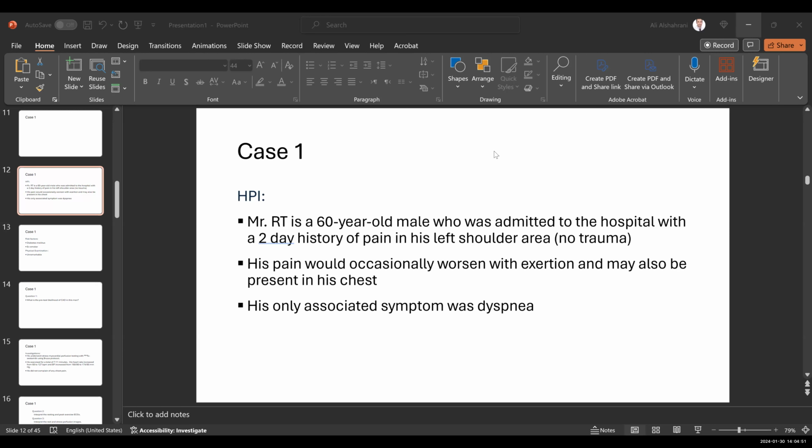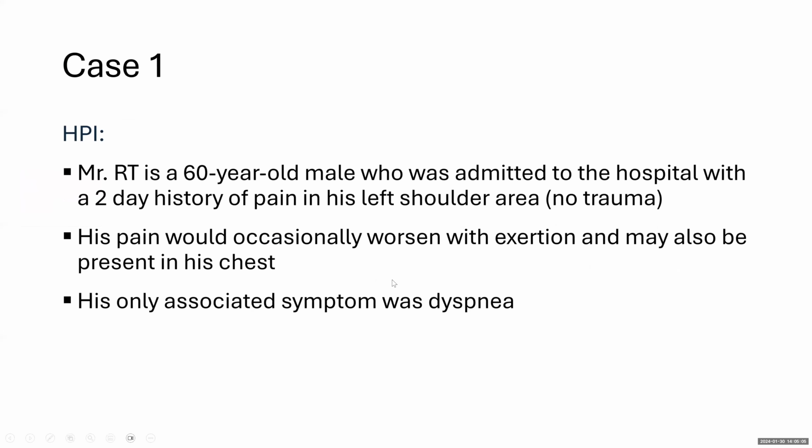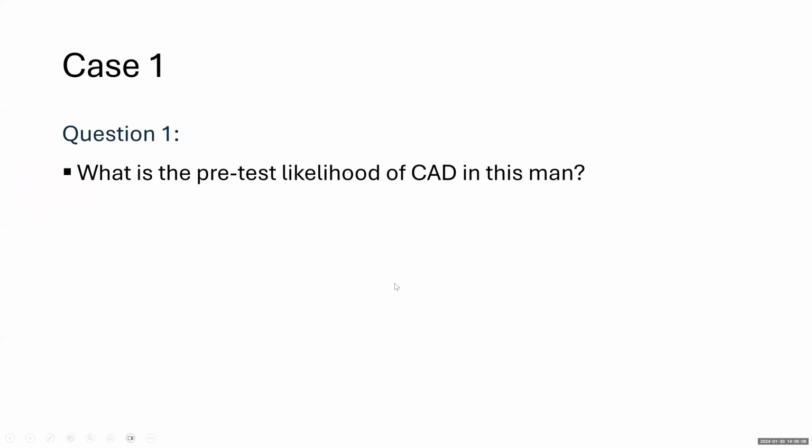Okay, so sure. Sorry, what is this now? So again, 60-year-old male patient. Okay, so high or moderate? Want to see more?